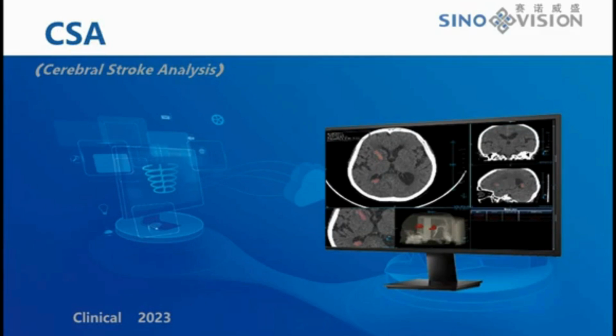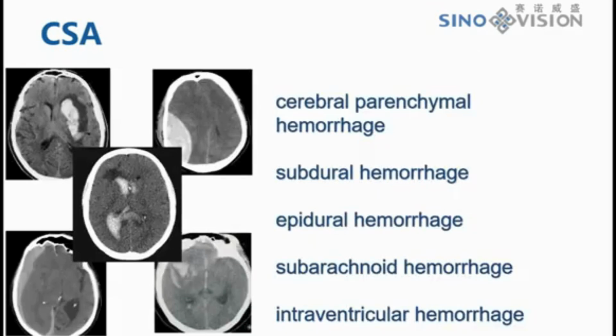This video will explain the stroke analysis CSA plugin for you. CSA enables quantitative analysis of cerebral hematoma and cerebral infarction in patients.